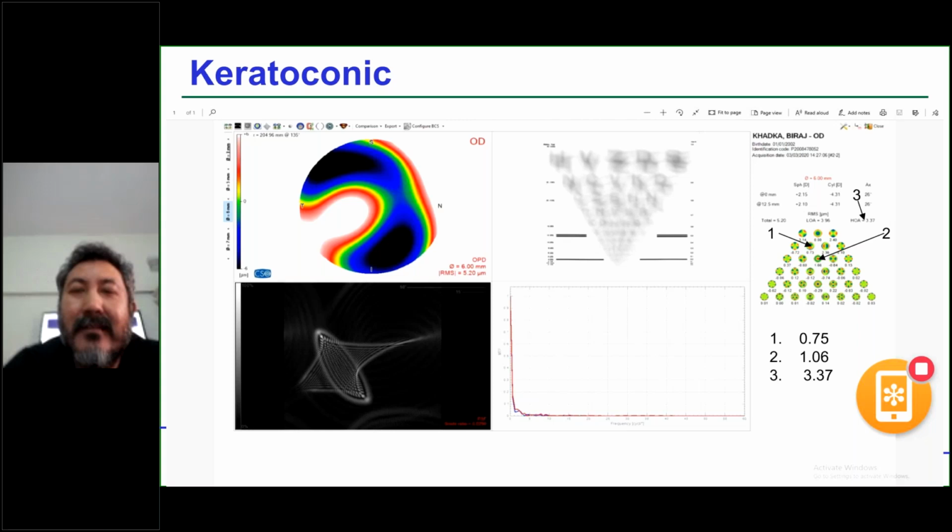All the things that I said are very important: keratometric value, the shape, the elevation maps, and everything. Sometimes keratoconus is wrongly diagnosed as VKC. They usually have subclinical keratoconus, and they keep rubbing their eyes with redness and congestion because the quality of vision is not good.